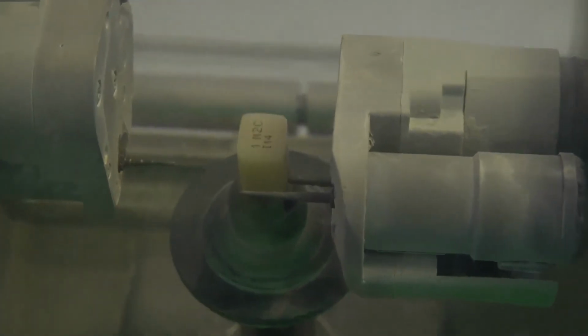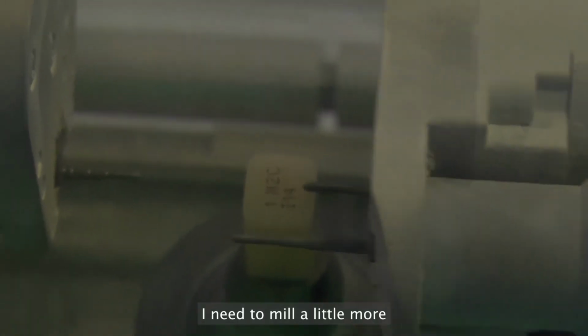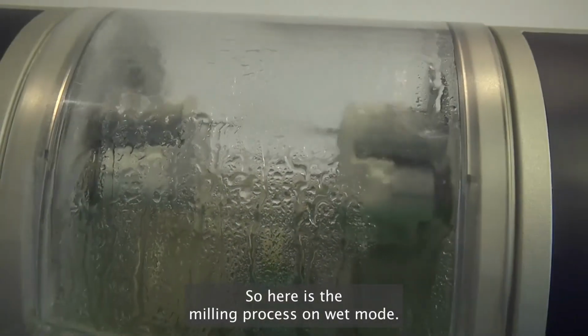Here on the 4-axis with only two burs, it could be difficult because the size of the burs is very big. And if I have undercuts inside my crown, my preparation, I need to mill a little more, and it could affect the shade, the final shade. So here is the milling process in wet mode.